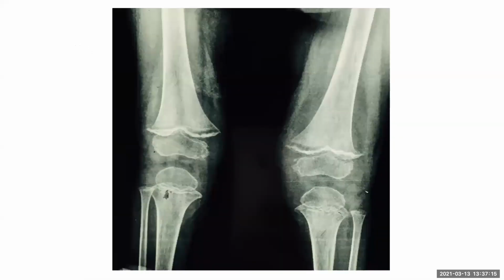Yes. So this patient has bleeding gums. Okay. The radiograph is not very good, but still we can see whatever is required. Okay, so can you describe this? This is a frontal radiograph of a skeletally immature patient, of both knees. I can see there is generalized reduced bone density. Also, there is a sclerotic line along the metaphyseal area of both femora.